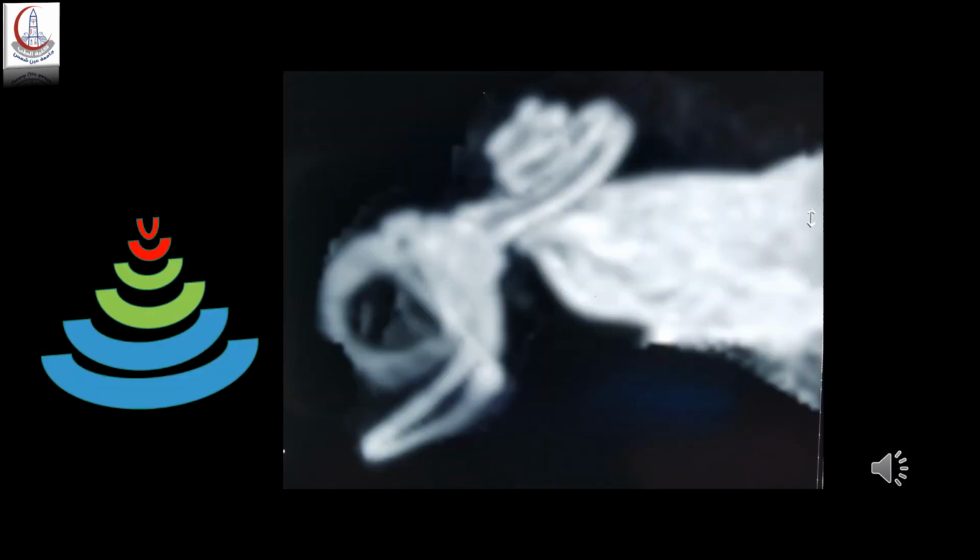After studying the bony configuration of the cochlea, we look inside the cochlea to look at the various scalae of the cochlea and if they are present or not, if they are patent or not. As you know, each turn is divided into a scala tympani and a scala vestibuli. So on each turn, we look at the scala tympani and the scala vestibuli, and in between is the negative shadow of the osseous spiral lamina.